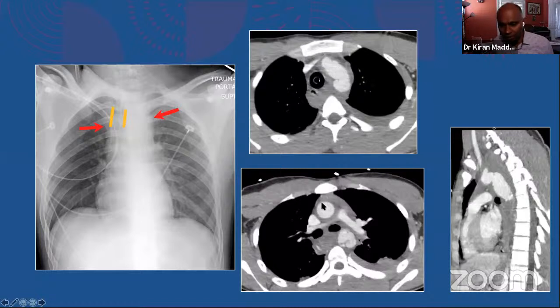Look at the normal aortic lumen here, the normal contour, and no intraluminal opacities or no intraluminal densities or hypoattenuation or tiny membranes. That's what I look for when I look at the aortic lumen. Whereas you come to the aortic arch, you see a tiny flap there. We call these any floating membranes within the aortic lumen a flap.